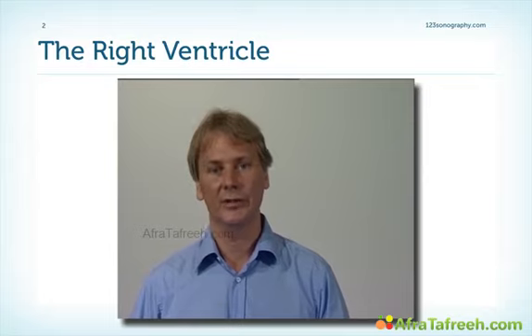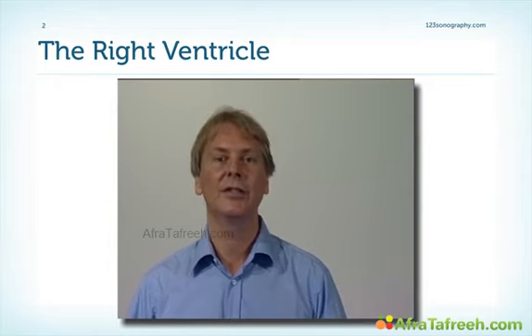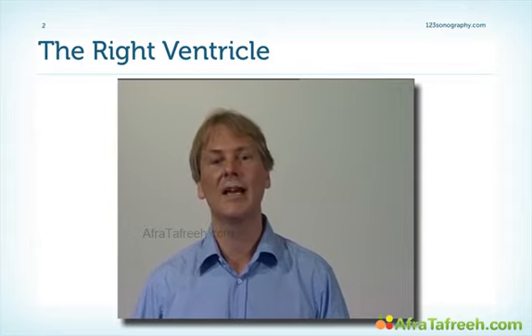Intuitively, when you learn echocardiography, you always focus on the left ventricle. However, the right ventricle is equally important, especially in clinical situations, for example, pulmonary hypertension. The right ventricle is actually more difficult to assess because it has a unique physiology and anatomy.